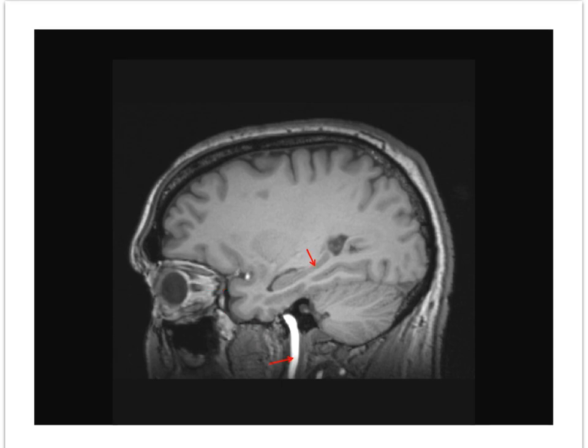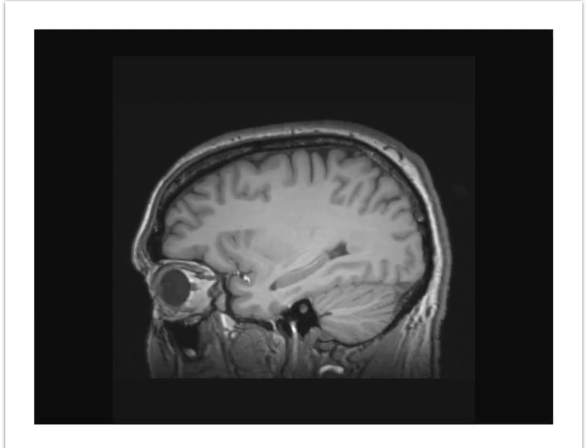The arrow above, again on the dentate gyrus of the hippocampal formation, and the lower arrow is on the cervical portion of the internal carotid artery. A very faint streak of white matter is visible, and this is the fimbria of fornix that arise as efferent fibers from the dentate gyrus of hippocampus. The hippocampus is outlined by dark CSF in the temporal horn of the lateral ventricle.